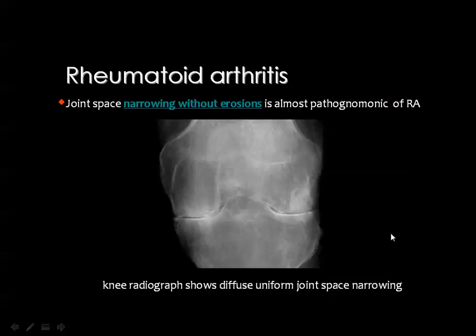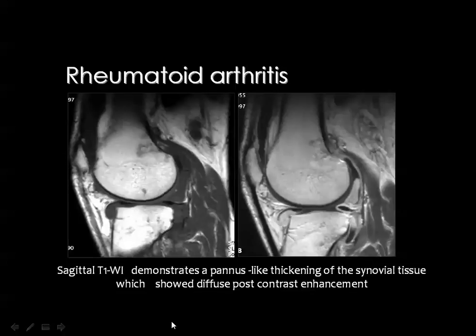Rheumatoid arthritis, as you all know, can also affect the large joints like the knee, the shoulder, the ankle, and so on. One of the major manifestations of rheumatoid arthritis in these large joints is mere joint space narrowing without bone erosions in most cases, but sometimes you can see bone erosive change. Of course, you know that this is not osteoarthritis, because in cases of osteoarthritis you have to see some osteophytic lipping, and you get non-symmetrical narrowing of the joint space affecting mainly the medial aspect of the joint. Sometimes you can see subarticular pseudocystic changes.